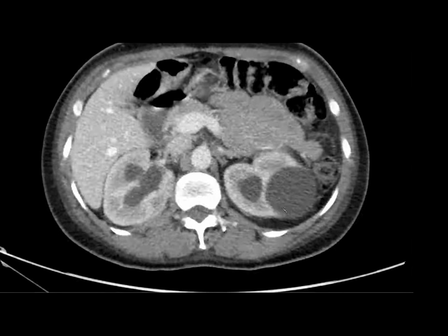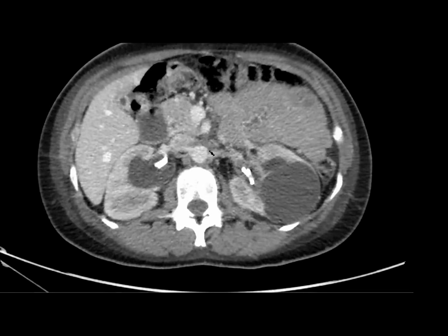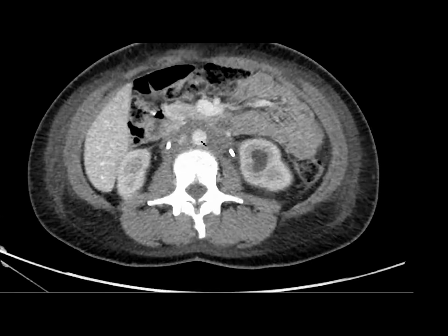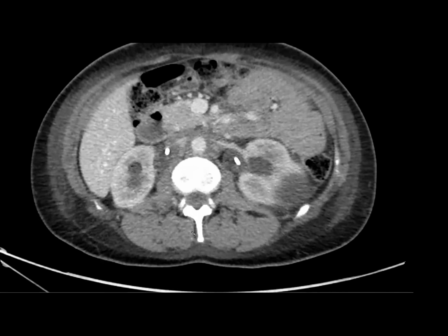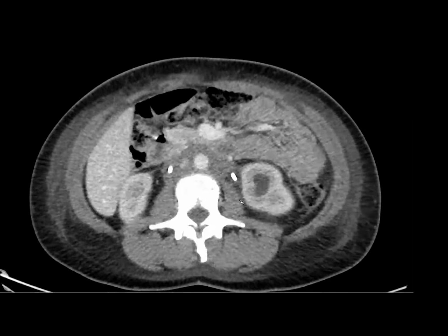Yeah, so we thought this was probably retroperitoneal fibrosis, and Anu is saying, or IgG4, exactly. And so lymphoma, we think about that also with periaortic soft tissue, but it usually lifts the aorta, it pushes the ureters aside, it might not obstruct the ureters. So we also have obstruction with stents in place. And so this is more on the spectrum of retroperitoneal fibrosis.